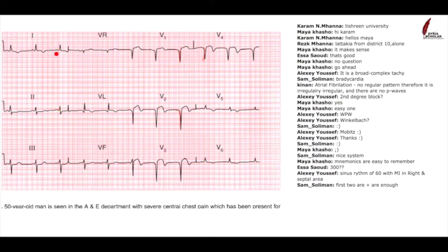There aren't any Q waves here. There aren't any Q waves here. There aren't any here. But we definitely have some big ones here. Confusing thing about this is where the transition point happens between aVR and lead V1 and aVL and V2. It's just how it's been printed out on the screen on the machine when it prints them out. But you can see there are definitely Q waves.